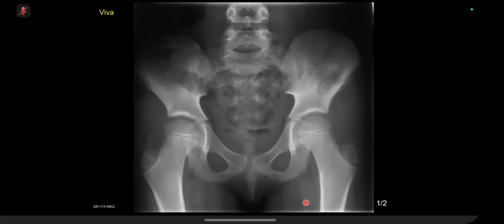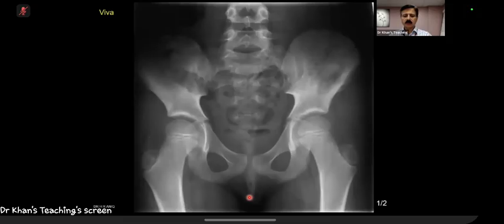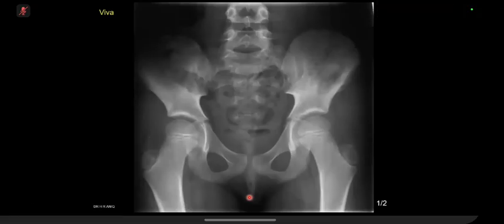So in the lateral iliac crest, there appears to be increased... Which side? Sort of left side. Okay. The iliac crest. So in the iliac crest, compared to the contralateral side, there appears to be a periosteal reaction or cortical irregularity. There's also possibly some lucency within the medullary cavity within the ilium.